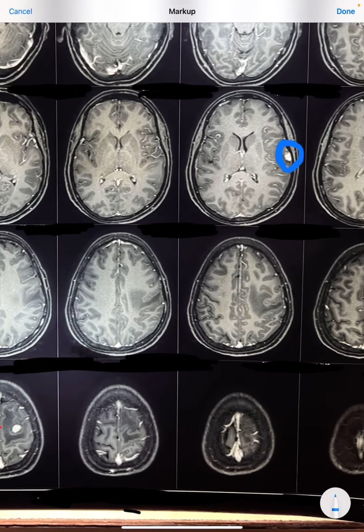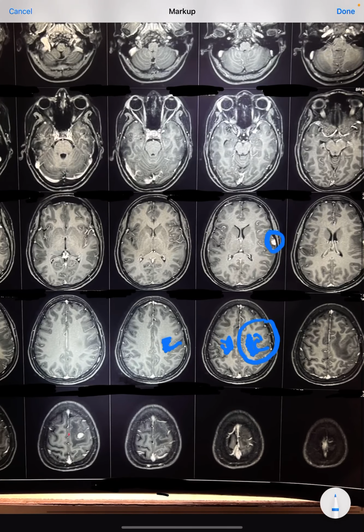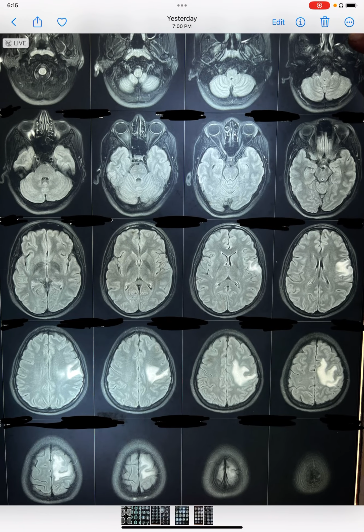We can also see there is edema in this area. This is the white matter which looks white, but here the white matter has a reduced signal, which suggests that this is edema. And we know whenever there is edema, it increases the intracerebral pressure. It can cause convulsion because of this marked edema. So there are two ring enhancing lesions in this patient, in the left posterior parietal, posterior frontal region and high frontal region, which were present with edema.